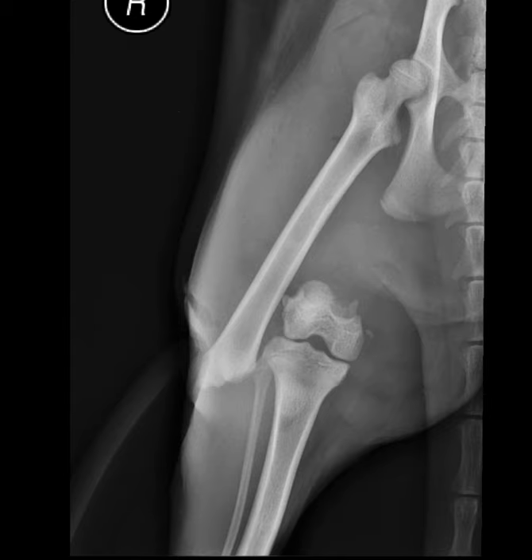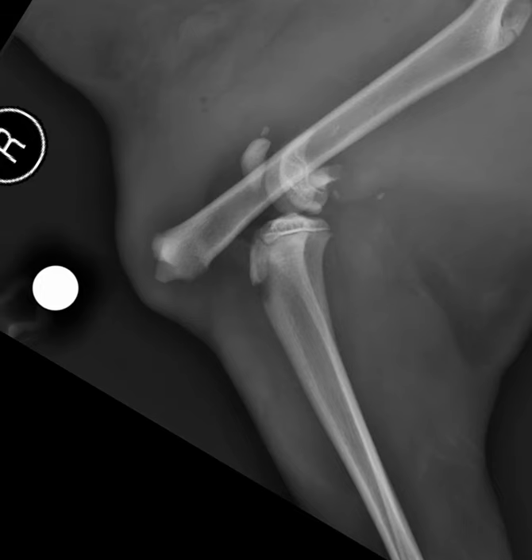So we can all see that there's a horrible fracture here with substantial displacement. I wanted to use this as a chance to practice fracture description. It's nice when we can compose a succinct sentence about a fracture, even a fracture as dramatic as this, so that we can discuss them on equal footing. I like to compose the sentence with the following components.